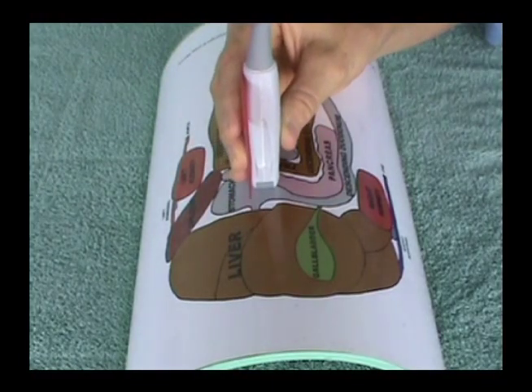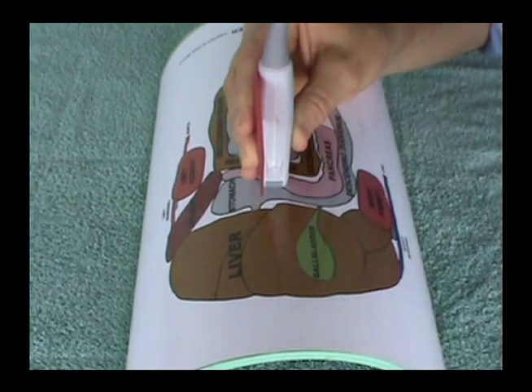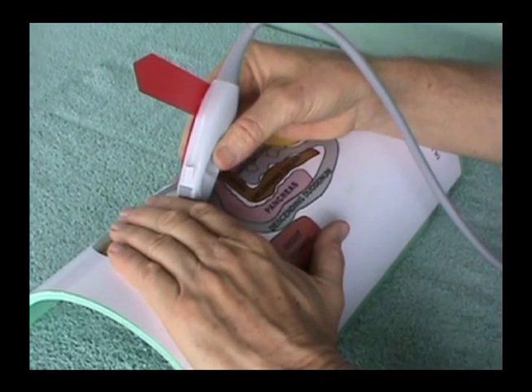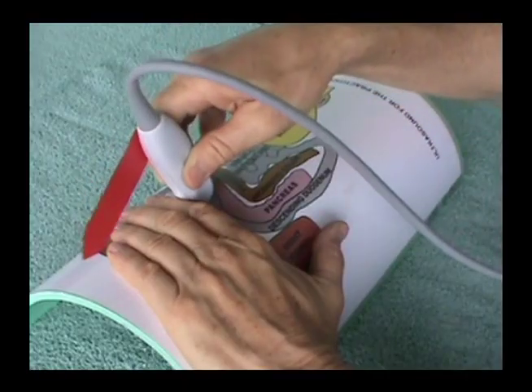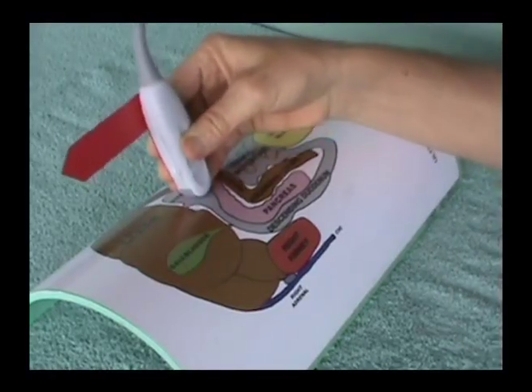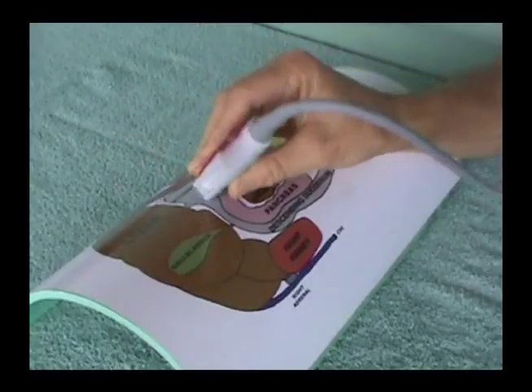Sliding is the only form of transducer movement in which the transducer's point of contact with the patient's body changes. Angling is a forward or rearward movement of the transducer along the plane of the transducer index and from a point of fixation. Fanning is a side-to-side movement of the transducer from a point of fixation.